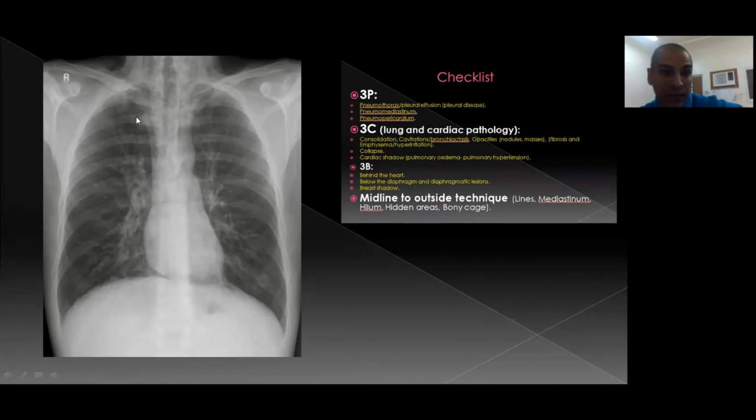There is a widening of the mediastinum, and we have lucencies inside the mediastinum. By the way, here we have surgical emphysema in this supraclavicular region. Any surgical emphysema you pick up, you should search for pneumothorax and pneumomediastinum and exclude these two.